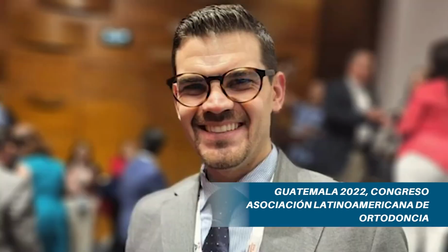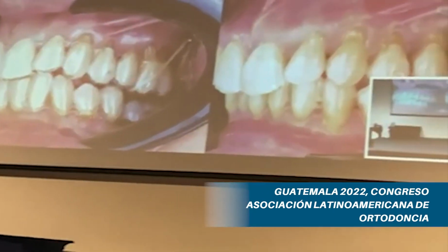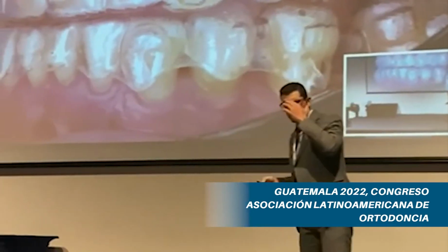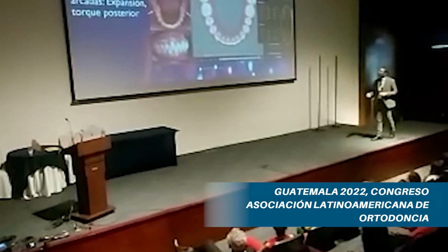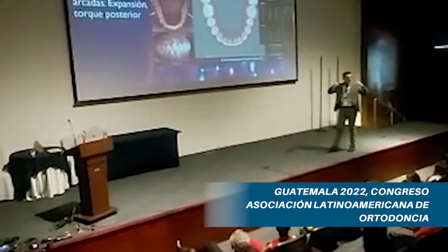When doing upper expansion, watch for strong contact points with the upper in the lower arch. Change the cast view to lower occlusal and try to adjust the antagonists in the following order: expansion, rotation, and intrusion. Always leave the intrusion last, as it requires attachments on the adjacent teeth.